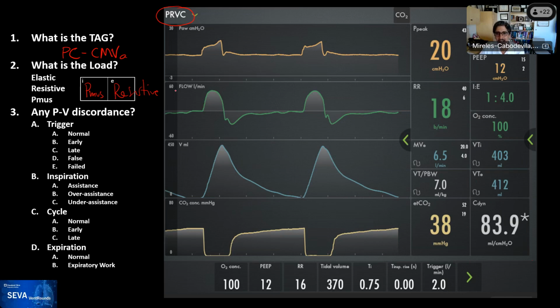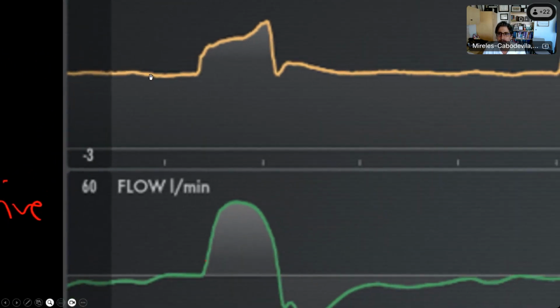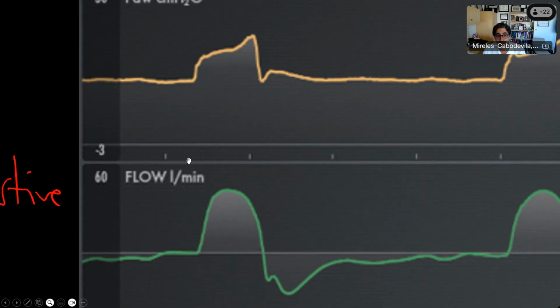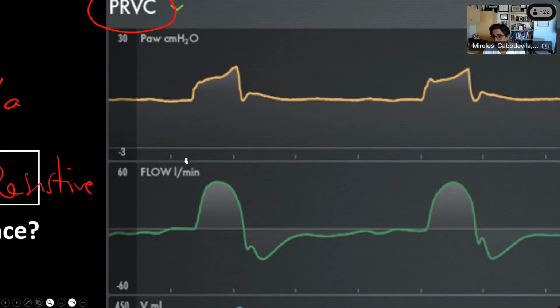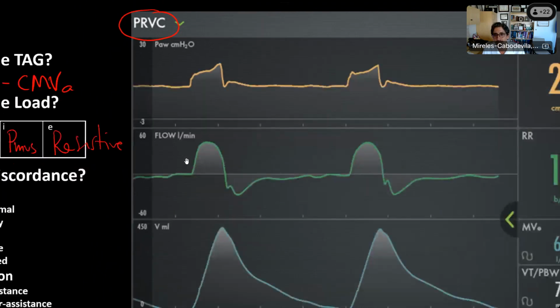So let's take a close look. I'm going to make it very big. Okay. Who's triggering the breath? Yeah. All right. So we are in alignment. You have said it's the machine. And we know that because the only device that knows that is the machine, because it's using the signal, and it will signal us if it's the ventilator.